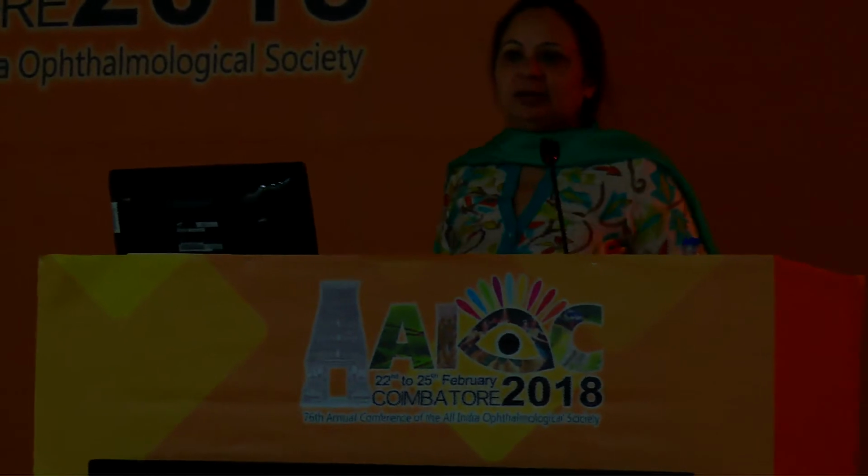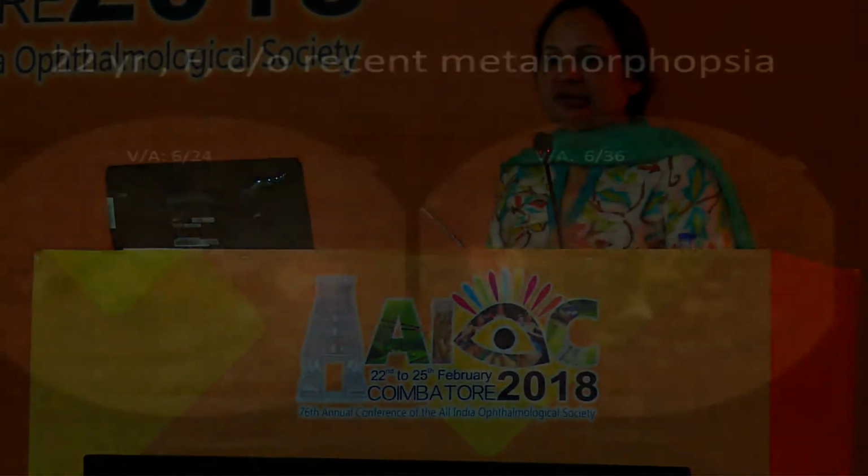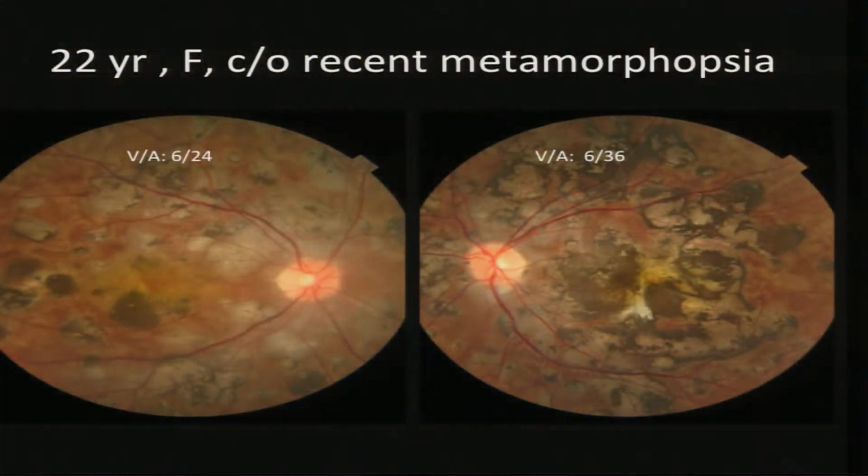A very good morning. I'm just going to show you two cases because there was a question asked right in the beginning that we do have OCT angiography now. So we see something new, we don't know what it is, how do we compare it with the gold standard, and how do we know what we are seeing is right or it's just one of the findings. So let's go over two patients where I'll show you how angio OCT helped us in managing these patients.